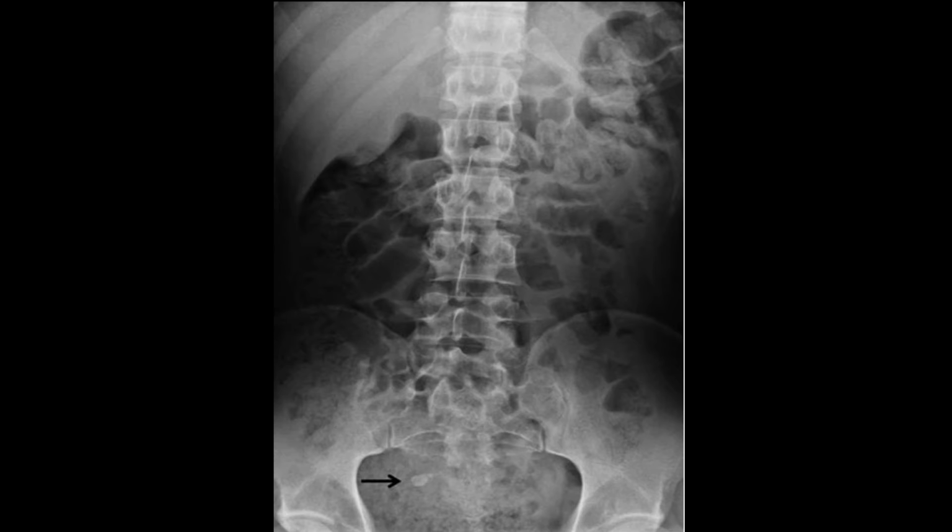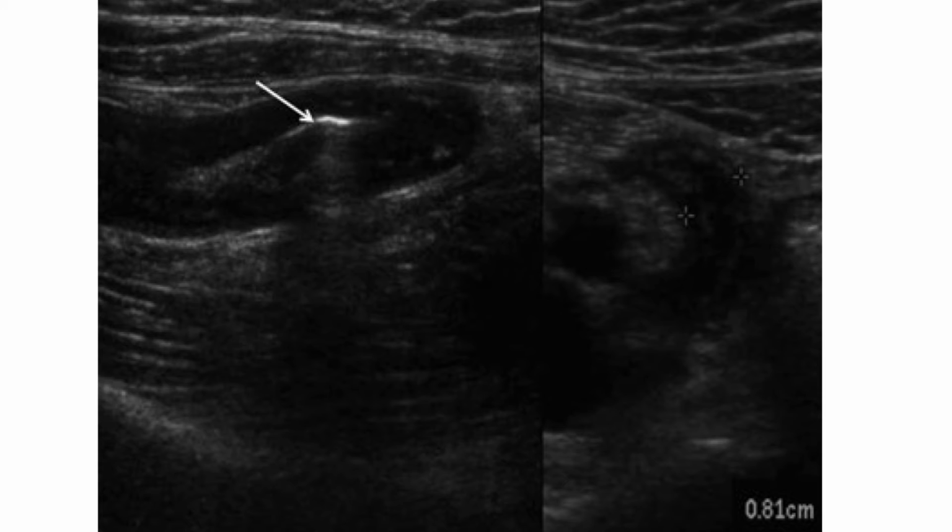Now, what do I do next? I would ask for an ultrasound. We have got an ultrasound report and we can see a blind ending tubular structure with a central hyperechoic area within, which is causing shadowing posteriorly. Now a hyperdensity causing shadowing will favor a stone more than air. Air also can appear hyperechoic, but it will not cause this posterior acoustic shadowing.